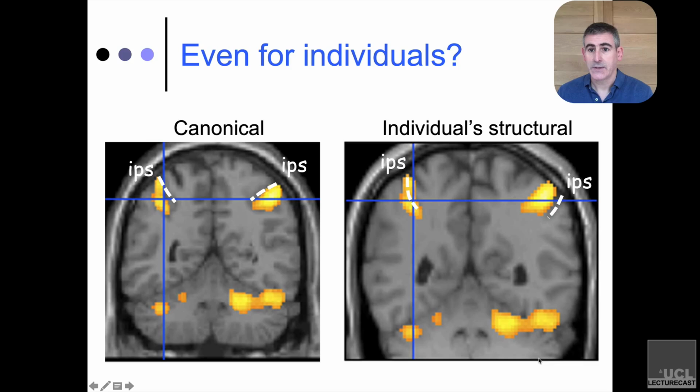So in one case, you would conclude that, yes, intraparietal sulcus is active, and if anything, it's more superior and into the superior parietal lobule. And in one case, you would conclude incorrectly that it's IPS, but it's also extending into the inferior parietal lobule. So in other words, all of the conclusions that you would draw from that would be incorrect simply because the background image you chose, presumably for convenience or because it looks great, localizes the activation to the wrong anatomy. And that's exactly what we need to avoid.